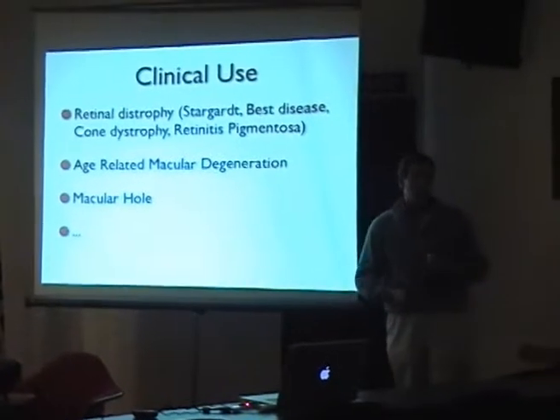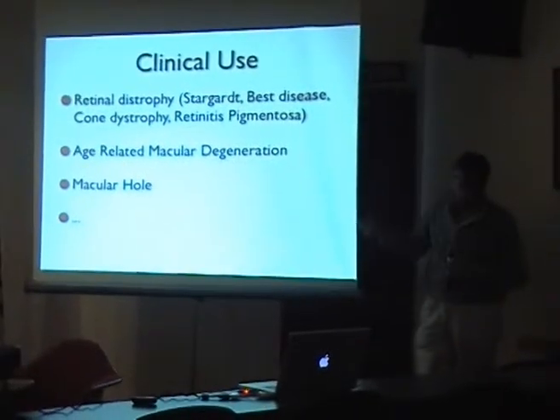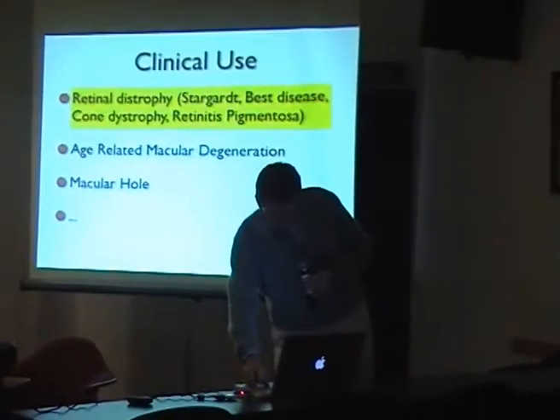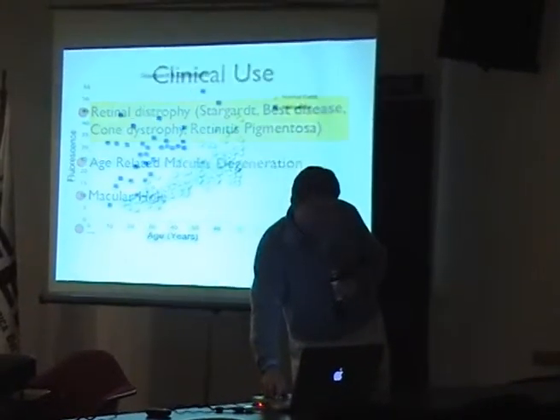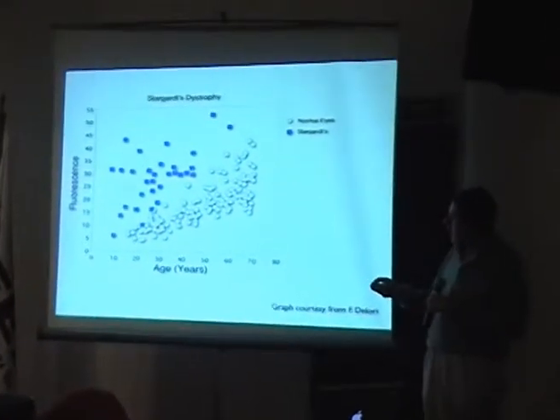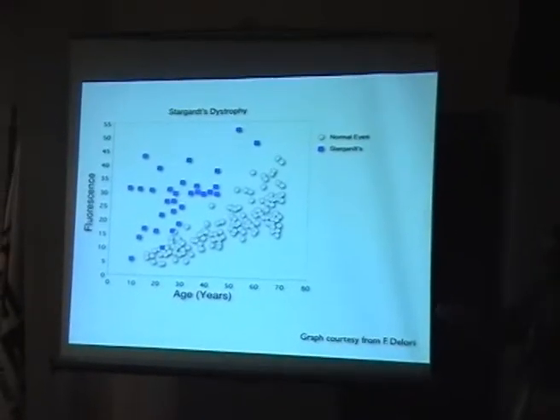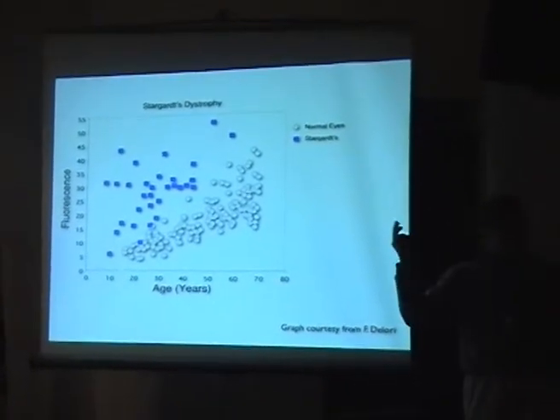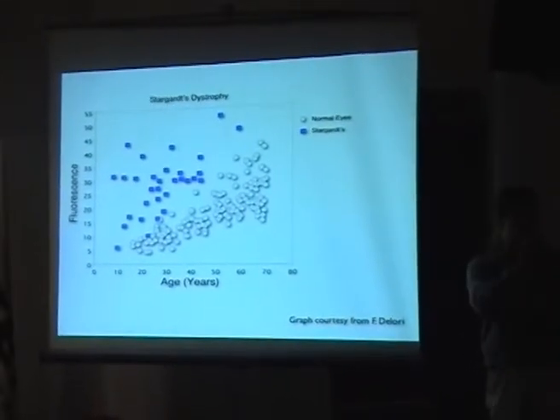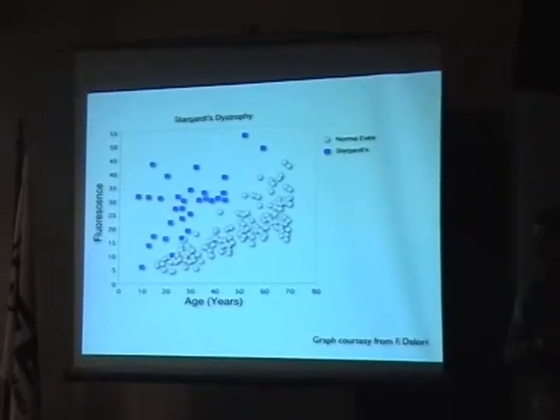Now, when autofluorescence is useful, here are some examples, and we will go through some retinal dystrophies with you. Now I go on to some information that we acquired with a different instrument, a spectral photometer that was able to measure lipofuscin in live patients.